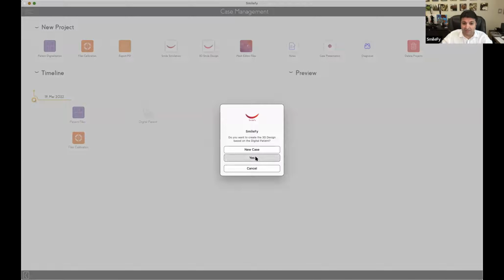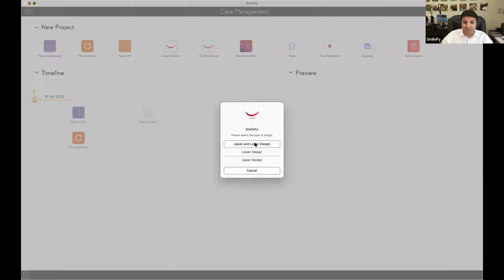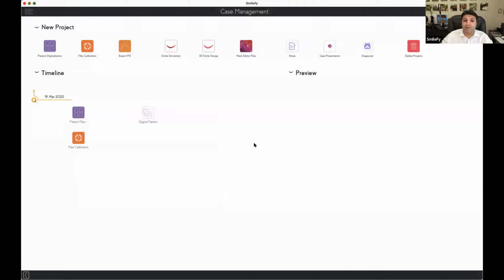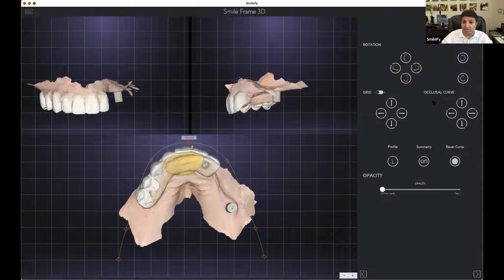We go to the 3D design, and we select upper and lower jaw. And we're gonna create everything based on our protocol. Very, very, very simple and super quick. So you're going to see, I'm going to explain more that I work on the app. So my vision is really that in 10 minutes, you have the design done and you can send it to the printer. Of course, if you have accurate files, accurate calibration, then everything is super easy and super quick.